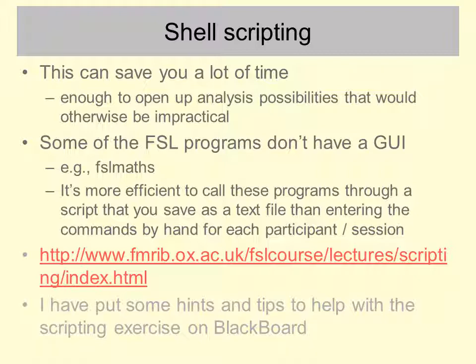It's much more efficient to call these programs through a script because you can then save the script as a text file. You haven't got to enter the commands again in the future, and the script can do the same thing to many participants or many sessions of data all at once, not having to repeat yourself.